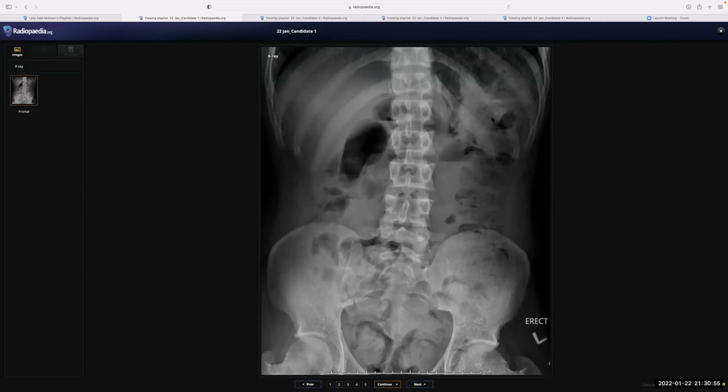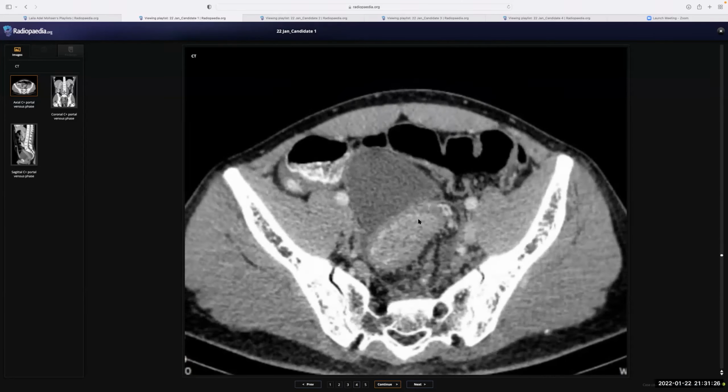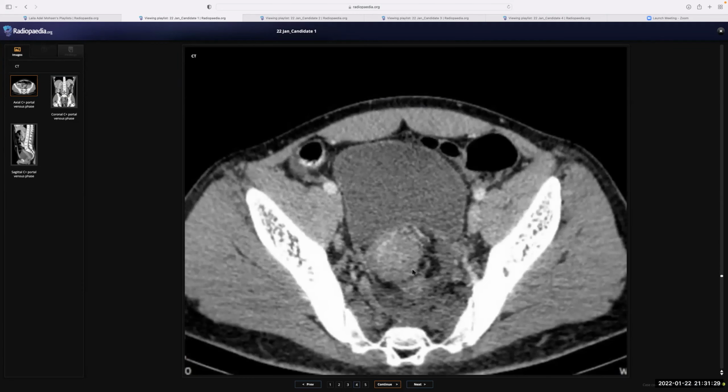So just put for yourself the regular steps. So for example, for me, I comment on the bones first, and then I comment on the calcifications, then the air, if there is extraluminal air, and what else? Then the renal stones. So make it for yourself, so you don't forget anything, and follow it schematically. So the patient did have a rectosigmoid cancer, and you are right to refer him for endoscopy and biopsy. And there is also this perirectal lymph node crossing the fascia here. Yeah. Okay.